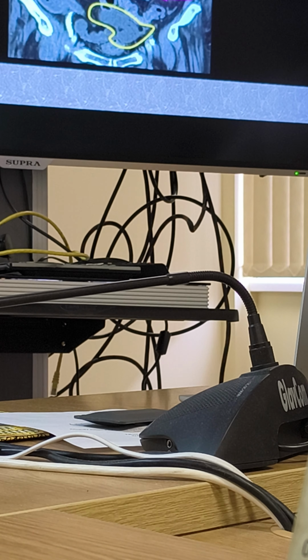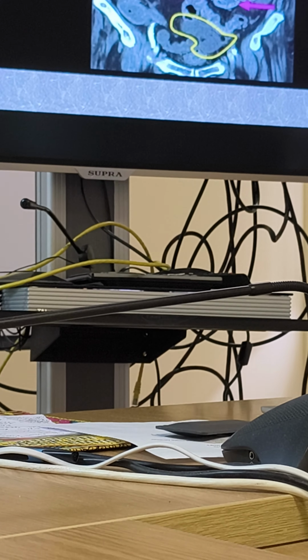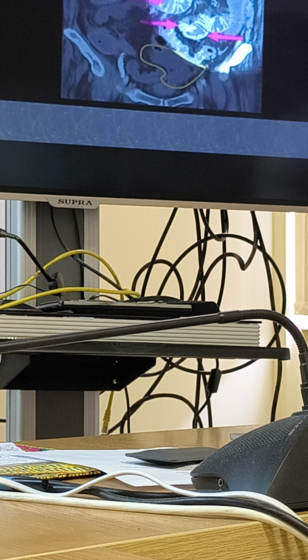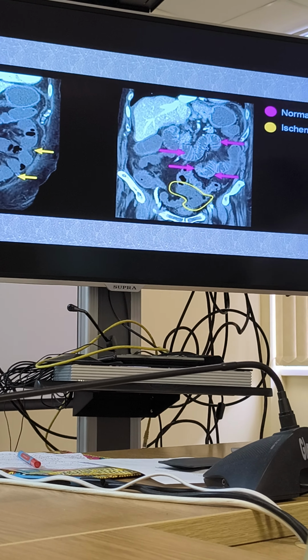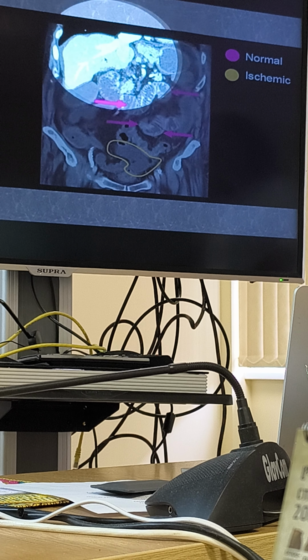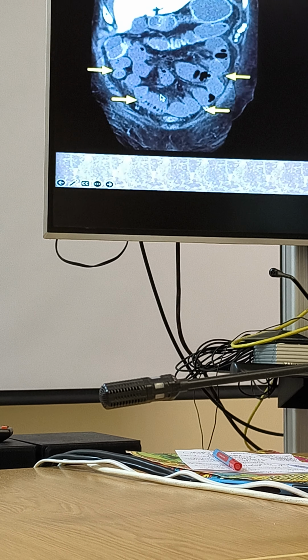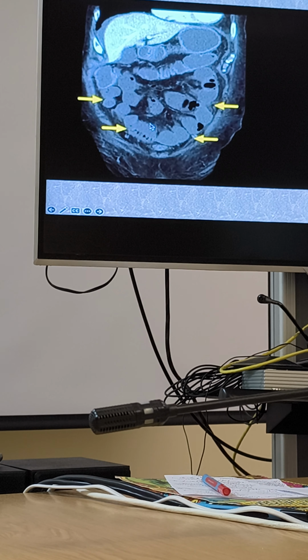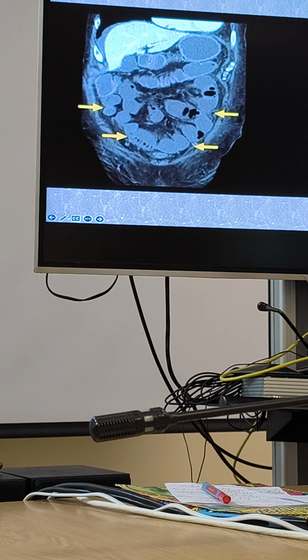This is important. Look how nicely contrast enhancement works in looking at the gastrointestinal tract. In this situation, we can see the bowel wall in a really nice white manner, and if it's alive, it has vessels, we see this white wall. And these are bowel loops with ischemia, and they're not enhancing. They are just gray, no this nice white thing.